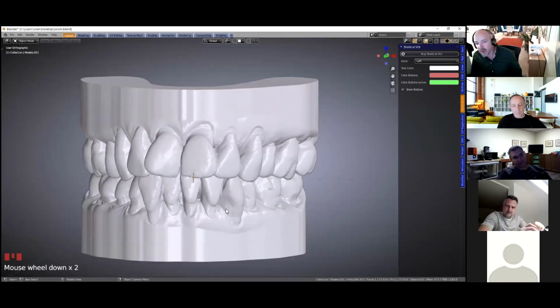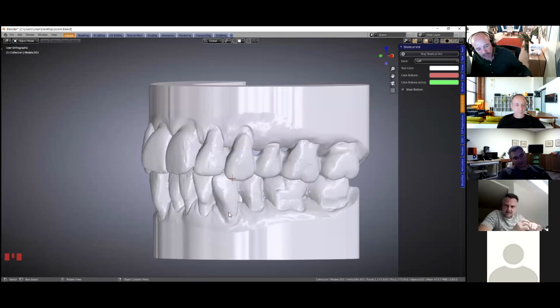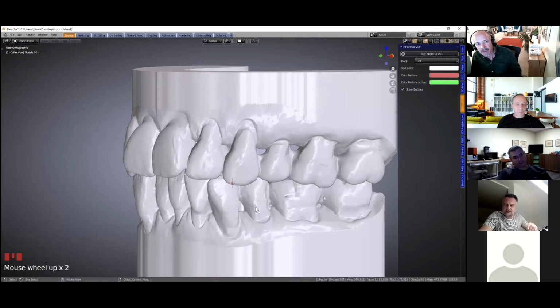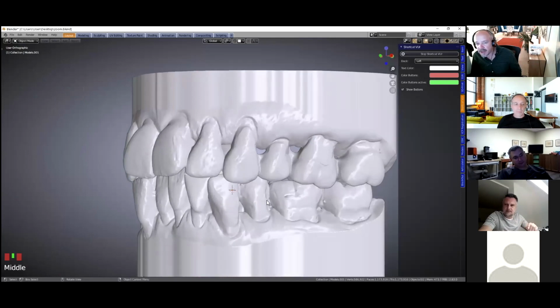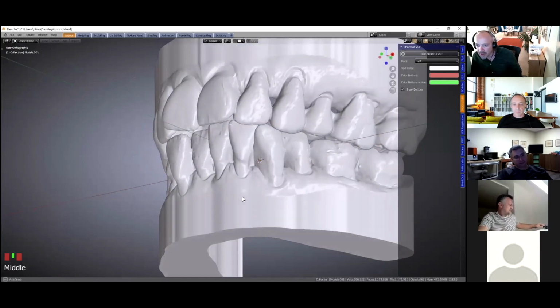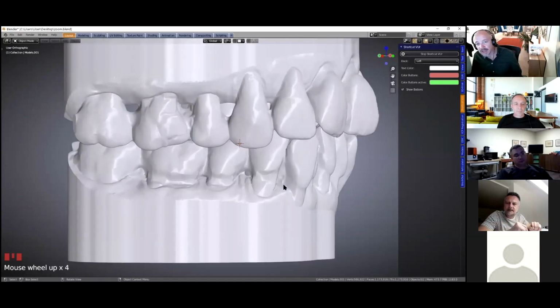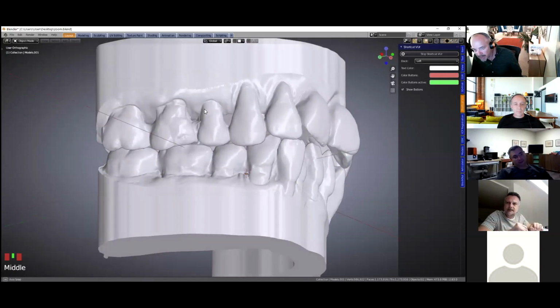We've got these models in the module folder, and you may have seen them already. We picked these because the teeth are really loose and undercut. I don't know how well a splint is going to work for this patient. It's a tricky case because of all those little gaps.